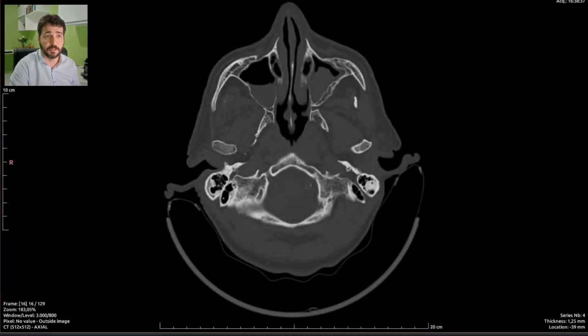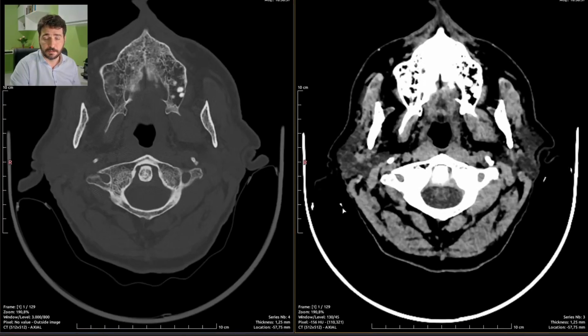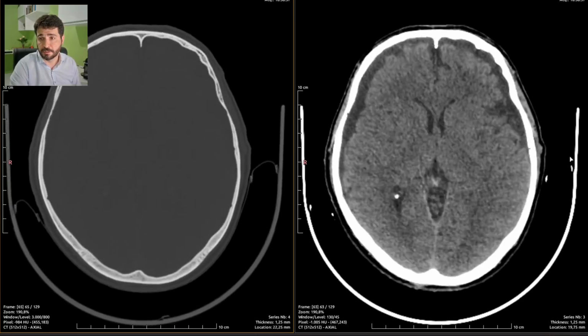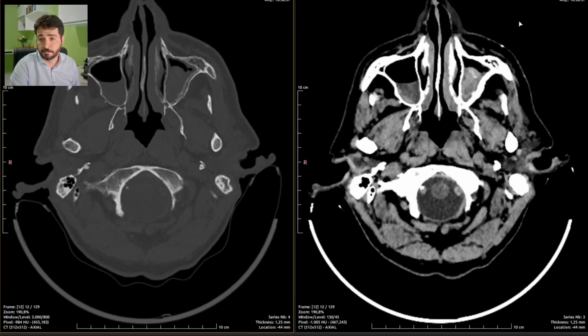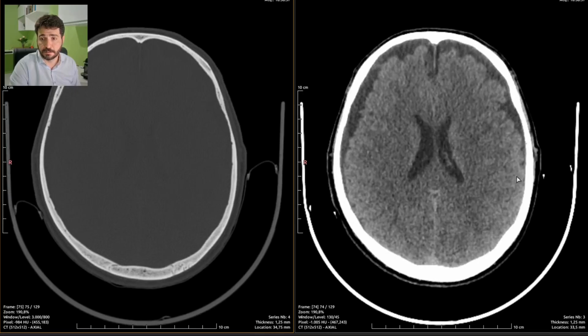It's downloading. It has finished downloading. I'm going to open up the images. This is brain parenchyma window. This is bone window. First row of the images is here. You guys are seeing as much as I can see. So this is what we have here.